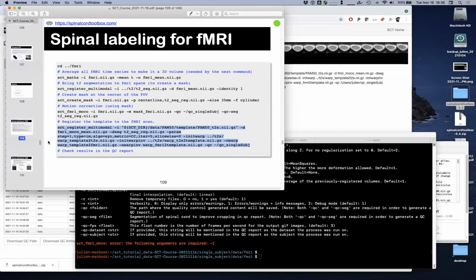If you anticipate that you will have a large pool of neurons that will activate along the superior and inferior directions, then smoothing will help.